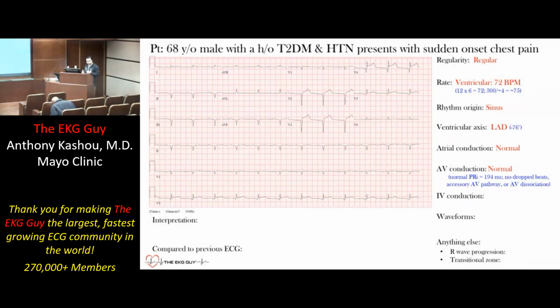This is where we're looking: is the QRS interval prolonged or not? In this case, we said we have narrow QRS complexes. Okay. We said we have an origin at the sinus node, no escape rhythm. So this is a normal QRS duration and interval at 86 milliseconds. In adults, remember, 70 to 110 milliseconds is normal. Once you hit that 120 milliseconds or 3 small boxes, it starts thinking prolonged. Okay. So that's what we have so far.